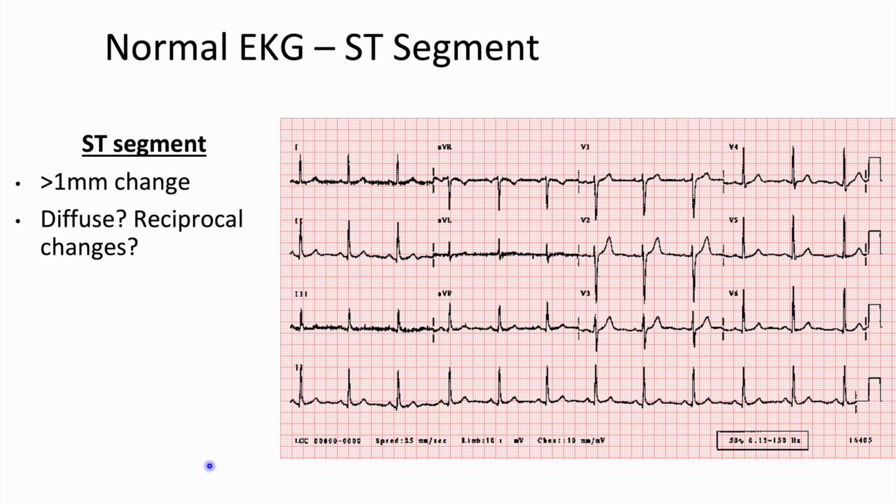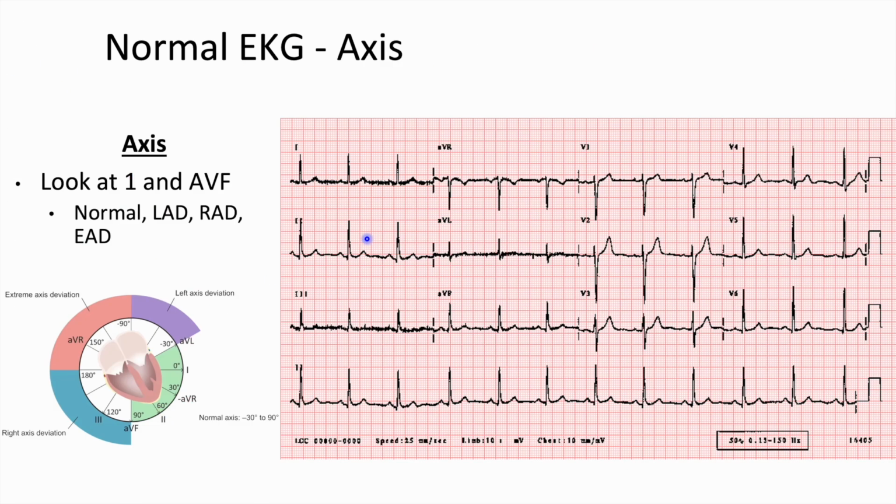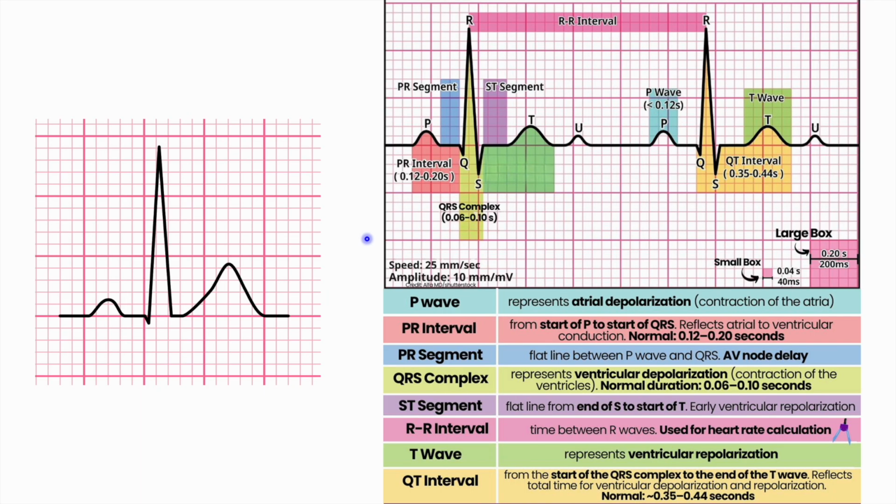The next thing you need to check is ST segments. This is typically indicative of myocardial infarction or heart attack because you can have ST segment elevation. That is not required, but you'll see that a lot. And so there's some other things that can cause it as well, but generally what you want to look for is ST segment changes. Let me pull up the ST interval.